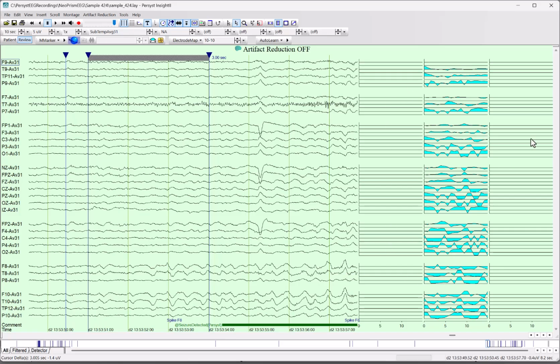So why are these flat on both sides of this? And this middle one, which is showing the phase relationships by frequency from 0 to 15 Hertz, that's that last step.